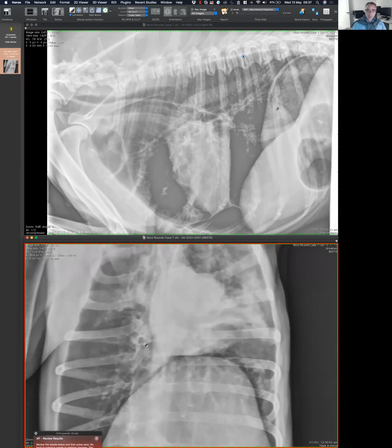Now we see the wall of the airway, and that is the definition of a bronchial pattern. And again, the book says be careful about calling a bronchial pattern, which is that ability of you to identify the wall of the airway, which you should not be able to, because the wall of the airway should not stop enough X-rays to create an image. With the exception of the principal bronchi, referring to the first, second generation. So basically in this area. The reason is that those bronchi have enough tissue in the wall to generate an image.